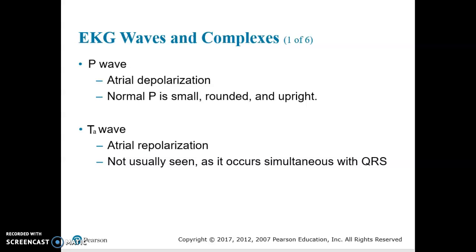The first thing that I want you guys to do is be able to define what an EKG is. So the EKG is a recording of the heart's electrical activity. So that's very important to know. Here is a list of what each thing on the EKG strip represents.